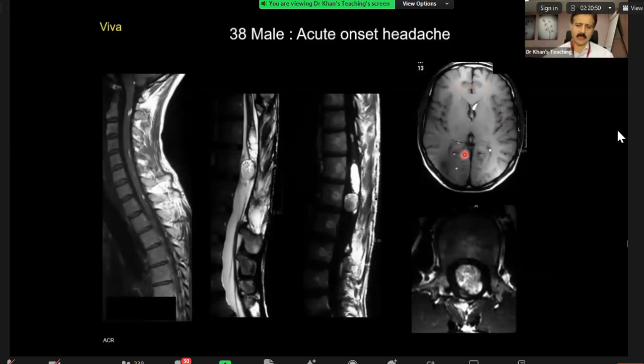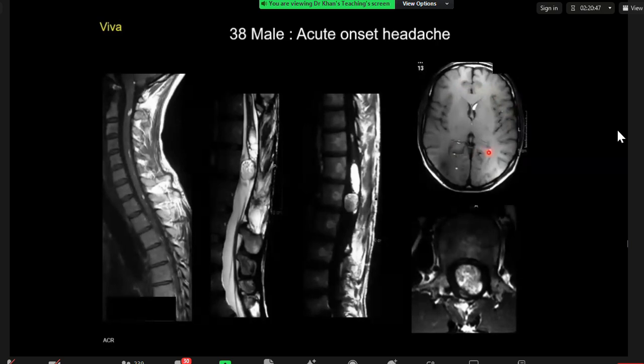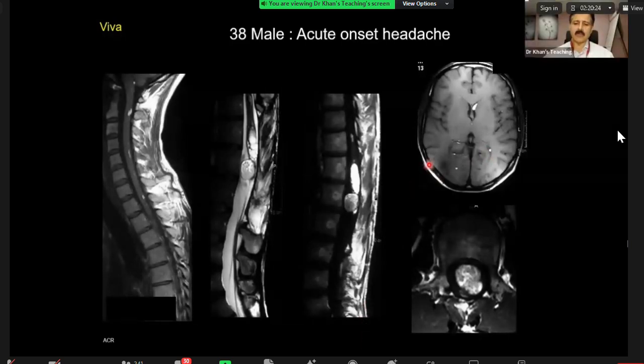What do you think is happening here? I think that it's ruptured because there's evidence on T1 of hyperintense foci along the cord, as well as an intramedullary lesion that is consistent with a lipoma or a dermoid. So I'm concerned that it's ruptured, especially in the context of acute headache. That's fine. So I've shown you this case before, not this case, similar cases. Ruptured dermoid on an MR, they will show you a T1 weighted sequence with high signal in the CSF.